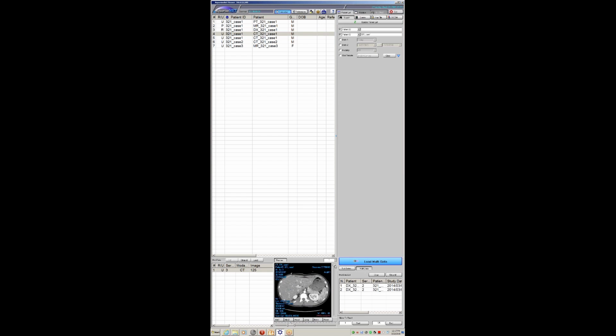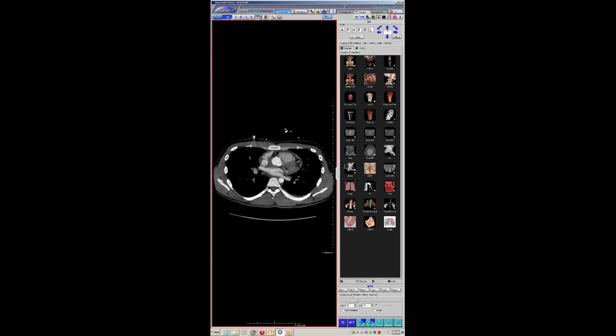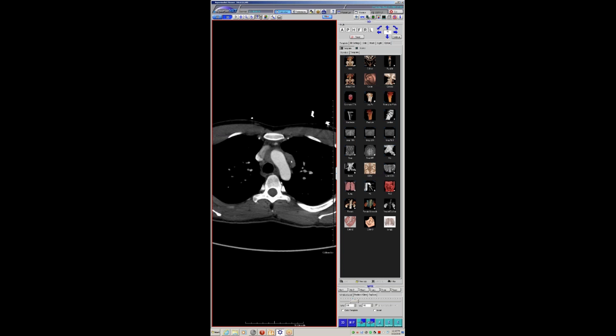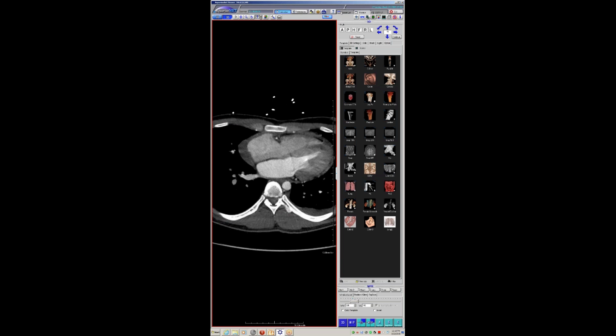He underwent a tap, and their initial concern, I guess he had tuberculosis exposure, was tuberculous pericarditis. And so they got a tap that was all bloody fluid, and they sent it for pathology. This was a post-tap X-ray, which I think most of us would be hard-pressed to really say anything but an effusion. Maybe that's a node or some soft tissue there, but this was just read as a kind of complex effusion given the history.